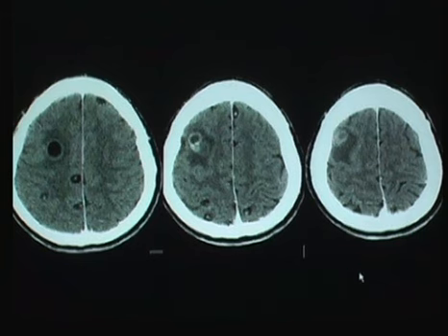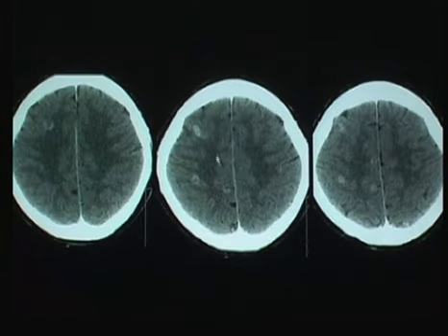as the inflammatory response and immune response became more pronounced. And as time went on and we followed this lesion, this initial lesion started to contract. And this is something that we would expect to eventually become a parenchymal calcification. But then other lesions started to enhance and degenerate and give this patient symptoms.